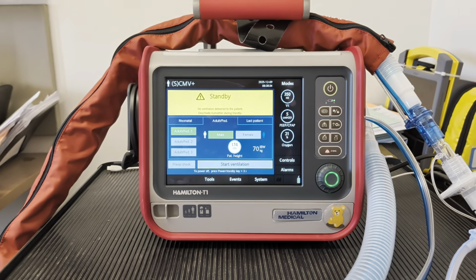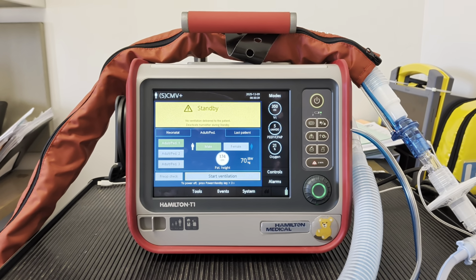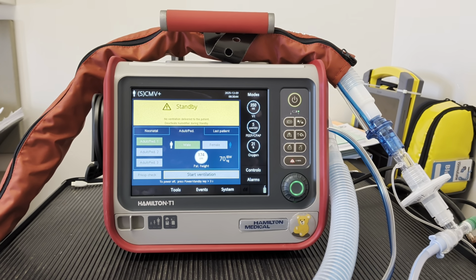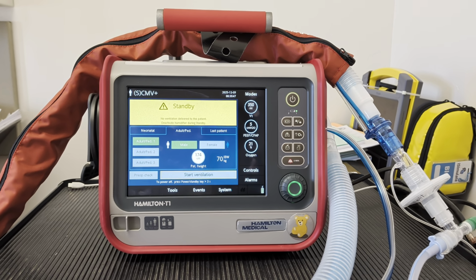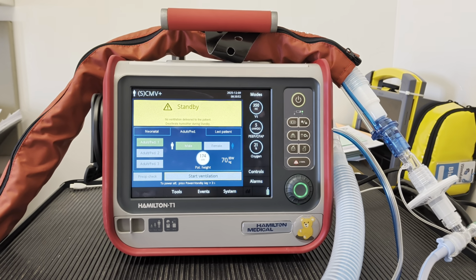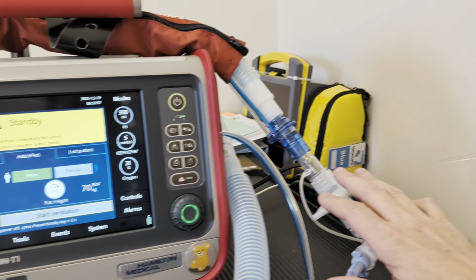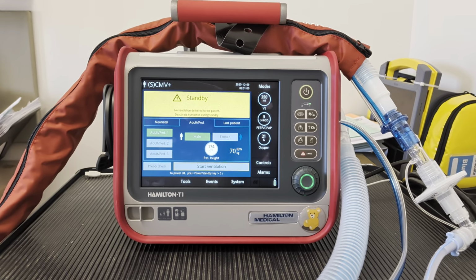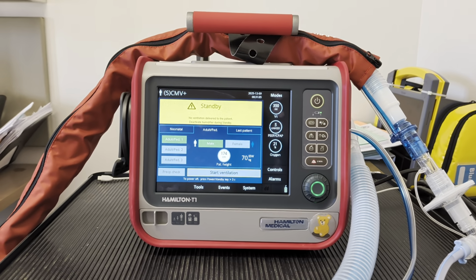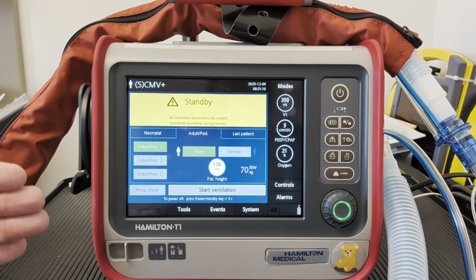What does this look like? So clinically, the patient is going to have signs and symptoms of airflow obstruction. If it is their underlying pathology, you are going to listen to lungs, you may hear wheezing. When you monitor capnography, which you should be on any ventilated patients, you are going to see a prolonged expiratory phase and that classic shark fin pattern that develops. And there are also some things that you should note on the ventilator as well.